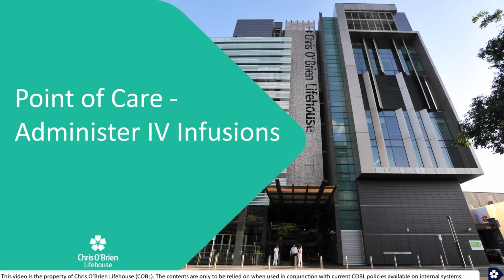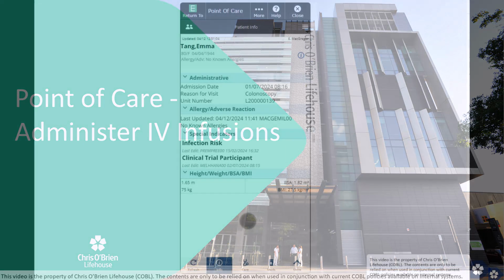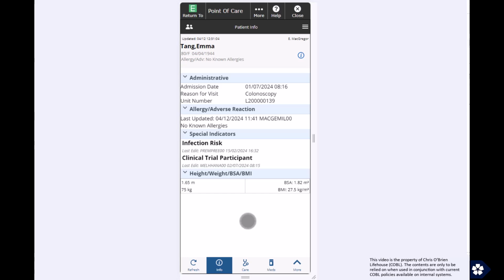I will be demonstrating how to start, pause, resume, and end an infusion using the point-of-care device. With your patient selected, click on the Meds tab.